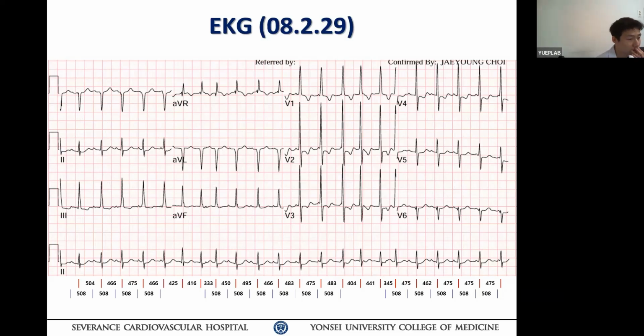Okay, Washi. Since Seyong has nicely outlined the P waves, this may be a normal sinus rate for a young patient because their sinus rates are faster, and the differing QRS morphology may be explained by fusion between sinus and the JET rhythm. Sometimes fusion, sometimes AV conduction. Yes. I don't know how old the patient is, but 500 milliseconds is pretty fast. A very young baby could be.